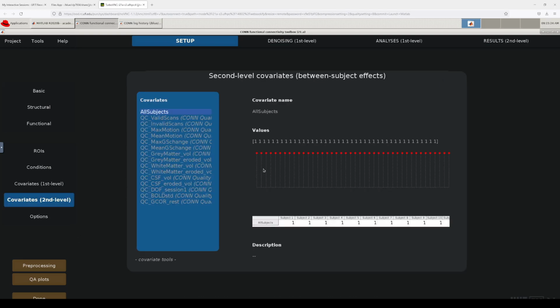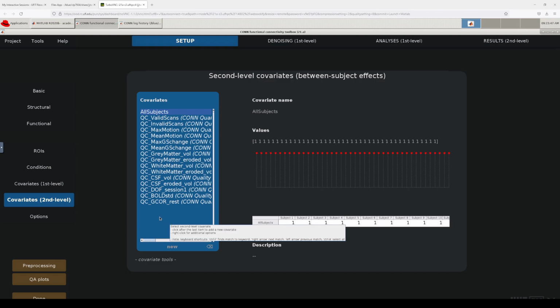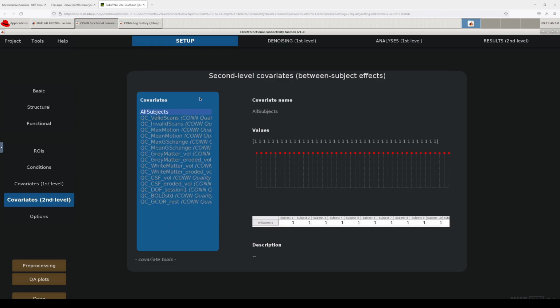That's quality assurance. Again, for our homework, don't worry about it. We're not going to get into there. That's a little bit more advanced. Again, if you're going to do this for a research project, you need to understand these quality control measures, read through the tutorial, spend time looking at the questions online and discussion online about how to deal with all of this. But I wanted to show you, these are now covariates that have been created that you could potentially add in to your analyses.